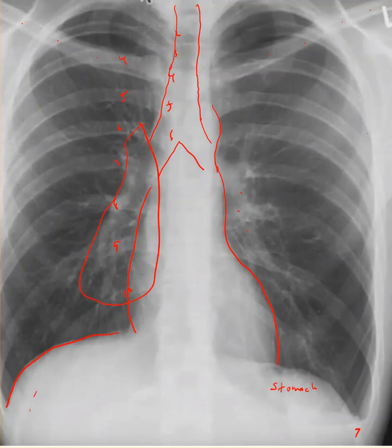And you go down, and you're still not really seeing much in the way of markings. Nothing, nothing, nothing, and really nothing down here. And this line here catches your eye. So right here is a line, and that's actually your pleura. And you can see it coming straight down here.